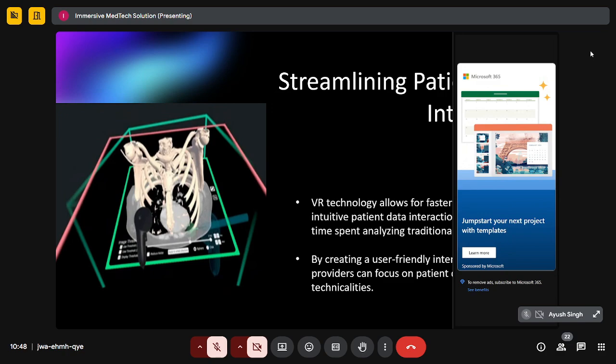So we can directly work on the part that is much more required, that is the implant part. Or even if we need to develop a model, what we can do is we can export out the particular file into STL and OBJ. And later on the STL files can be imported with ANSYS and we can create a mesh.